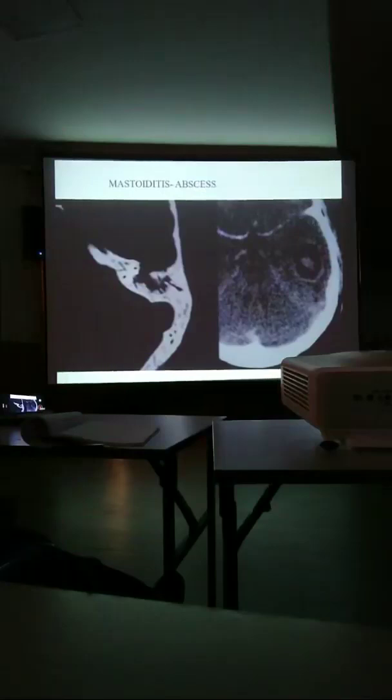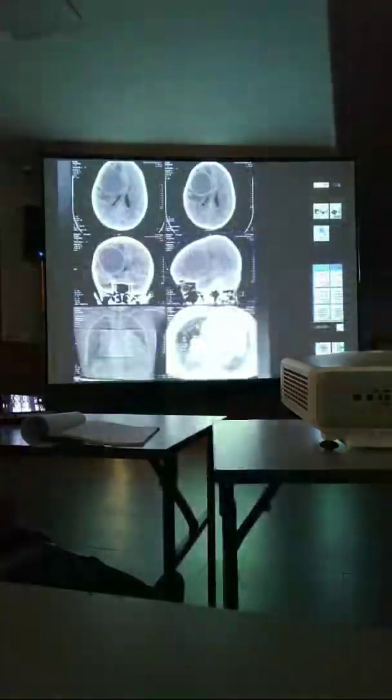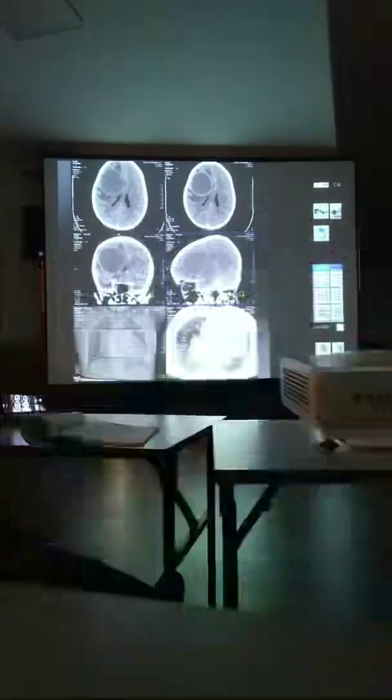And you should find out the source. Is the mastoid responsible? Here it is acute suppurative erosion of the tegmen tympani entering into the brain parenchyma. Here it is frontal osteomyelitis entering into the brain parenchyma. It is a skull base defect, a cribriform plate defect presenting as meningitis. And it is tetralogy of Fallot, the child presenting as cerebral abscess and seizures.